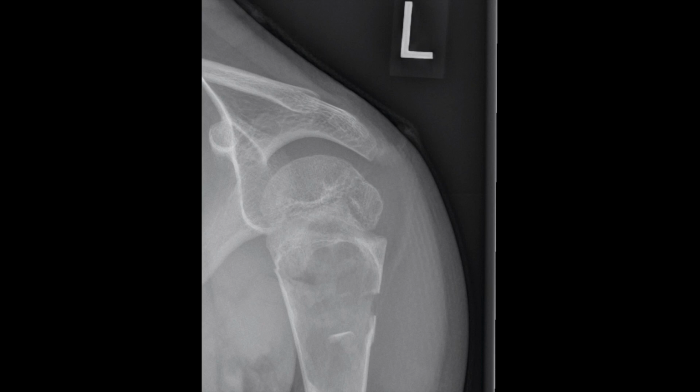So keeping that in mind, let's go back to the radiograph without any of the drawings on it. Do you see how there's a large, well-outlined area of darker gray bone in this humerus? This is a bone lesion, and in this case, it would be described as a lucent lesion because it's less dense than the surrounding bone. But what does the word lucent mean?